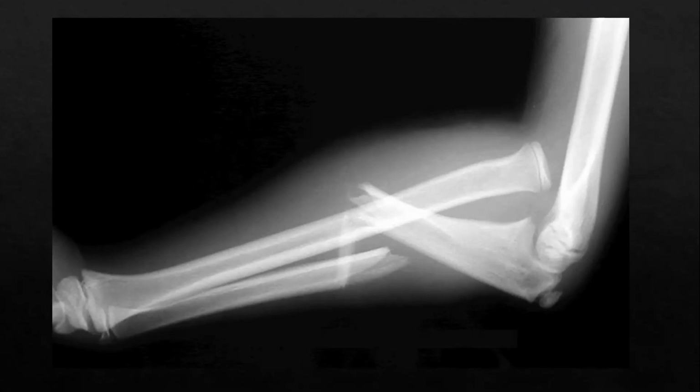Okay, so it looks like we've got a lateral X-ray of the forearm of an unknown patient and unknown arm. In terms of the adequacy, seems fine, can see everything, can see a little bit of the distal radioulnar joint and the elbow joint.